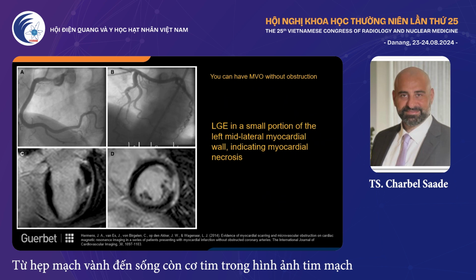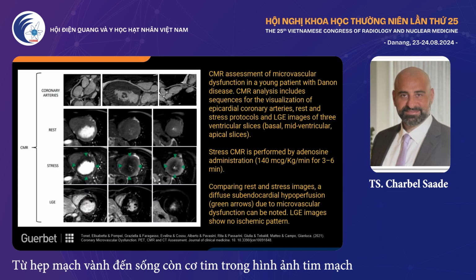Another example of a late gadolinium enhancement of the mid-lateral myocardial wall. This is necrosis. You can see that quite nicely there as well. Normal coronary angiogram. Then lastly, I want to touch on stress perfusion.